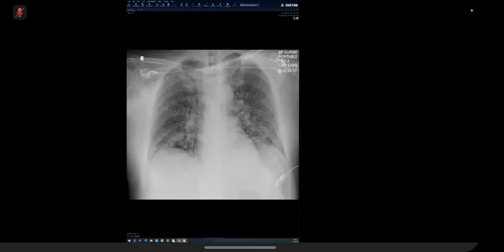So this could represent again cardiac failure. Nodules, cardiac failure. No, I think they are vascular markings, prominent vascular markings. Okay, so if you're saying all of these are end-on vessels and this is just pulmonary congestion, if that was true, why does he have an ETT? Why is the heart not enlarged?